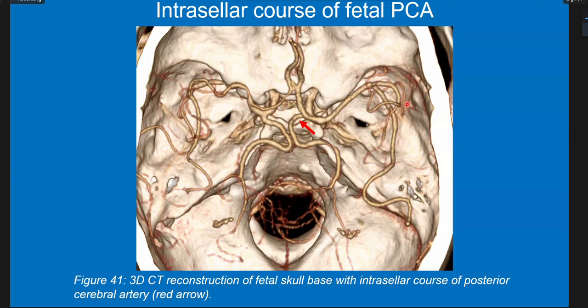It's another vascular anatomic variant. You can see the medialized course of the fetal PCA coming from the ICA here. And the artery both coursing over the dorsum sellae. But importantly here is the medialized course of the fetal PCA.